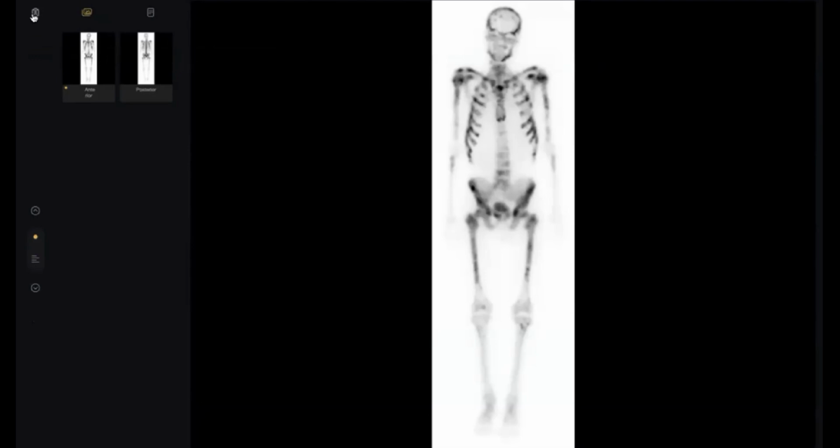Next candidate. Doctor, sorry, can I ask a question regarding the photopenic area in the kidney? Was it a renal lesion, or how is it related to Paget? It may be a side finding. One second, I will see Radiopaedia because I don't know the answer. I will answer you, wait. Okay, thank you. Next candidate, are you ready?